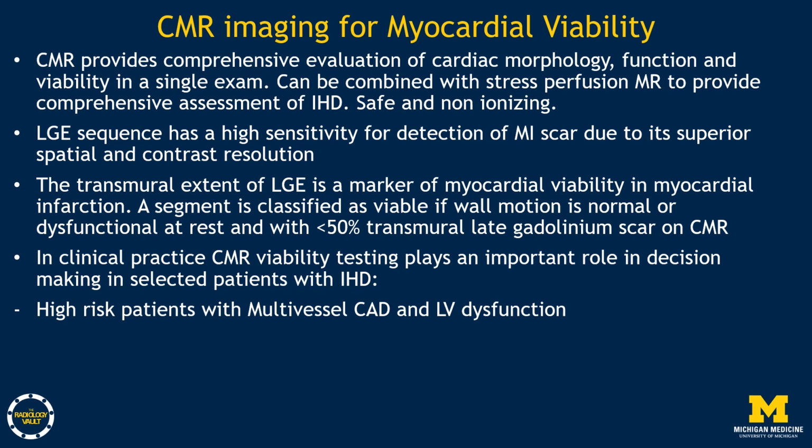Furthermore, it can be combined with stress perfusion MR to provide comprehensive assessment of ischemic heart disease. Cardiac MR is safe and non-ionizing. The late gadolinium enhancement sequence has a high sensitivity for detection of myocardial infarct scar due to its superior spatial resolution and high contrast resolution, particularly in relationship to nuclear medicine techniques. The transmural extent of late gadolinium enhancement is a marker of myocardial viability.